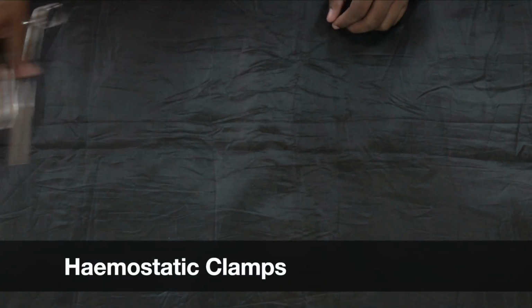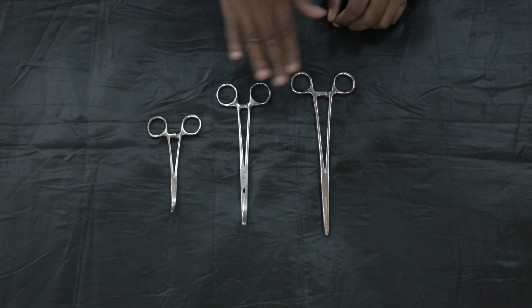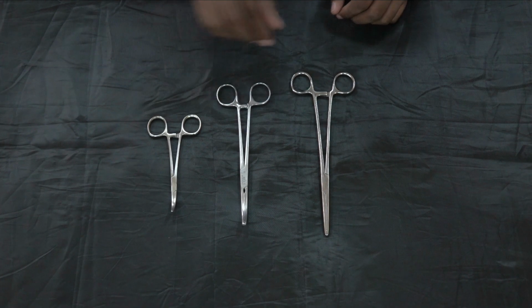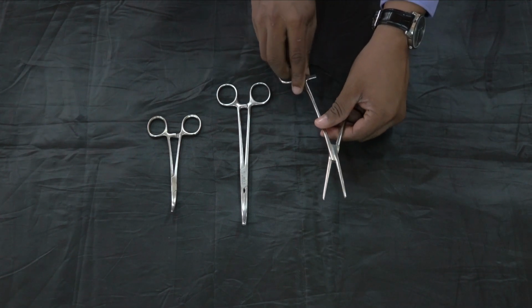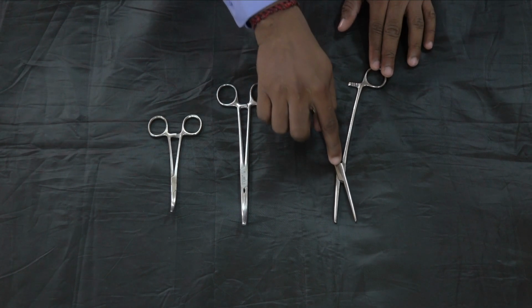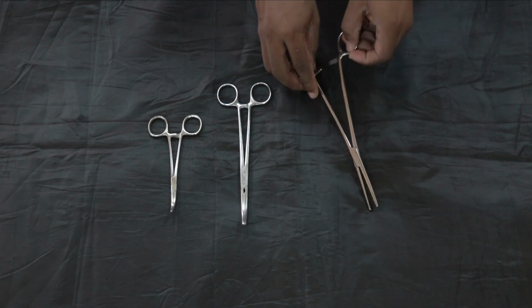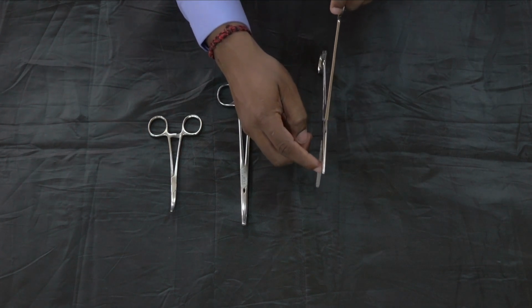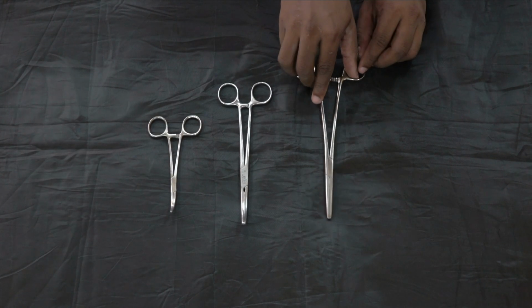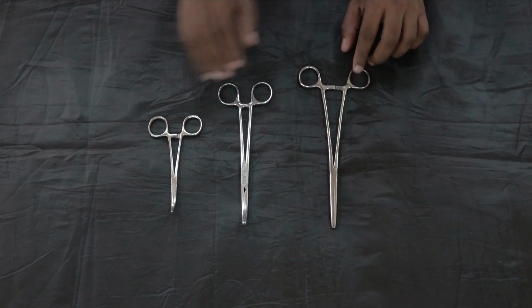Another set of instruments is called hemostatic clamps, which come in different shapes and sizes depending on the need. This is a straight clamp which has a handle with lock, straight shaft, and the inside of the jaw is specially designed to have a transverse ridge, which helps to hold the tissues and the blood vessel together tightly to achieve hemostasis.